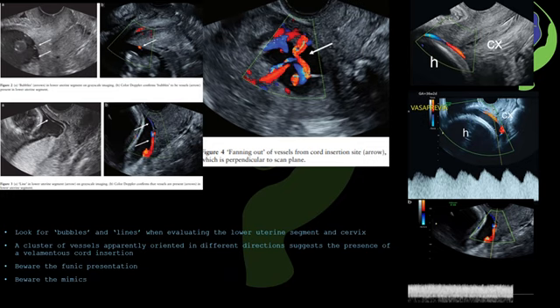In the case of a maternal blood vessel, the waveform will be pulsatile, but the rate of the pulse will be in synchronization with the maternal pulse. Also, a maternal blood vessel will remain fixed in location, and it is usually located along the lateral uterine wall rather than over the internal os.